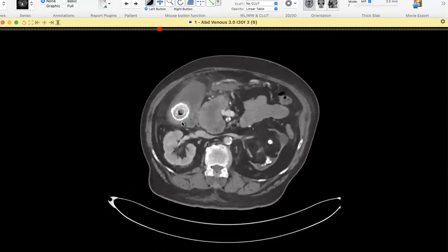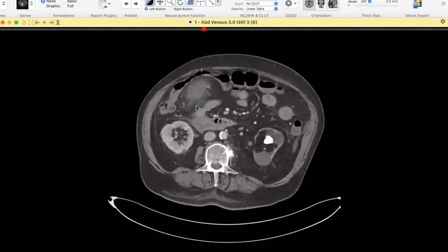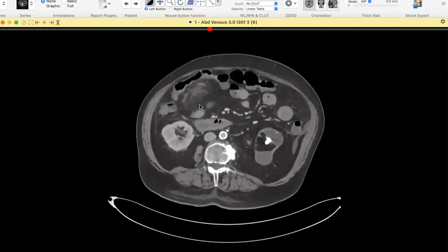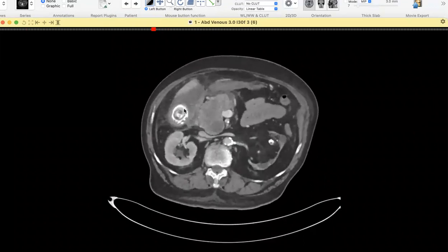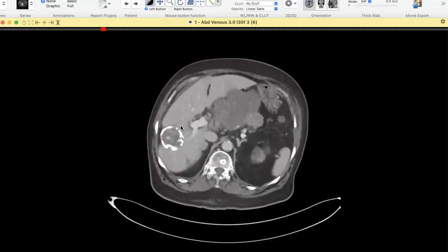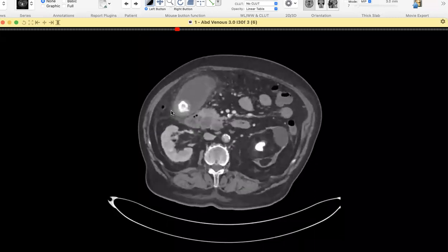And then you have a large gallstone, quite clearly in the gallbladder. And additionally, what I was looking for you to mention was there was fat stranding adjacent to the gallbladder. Right. And there's some fluid, there's some thickening. So this is cholecystitis. Okay, so this fluid and everything is related to the gallbladder.